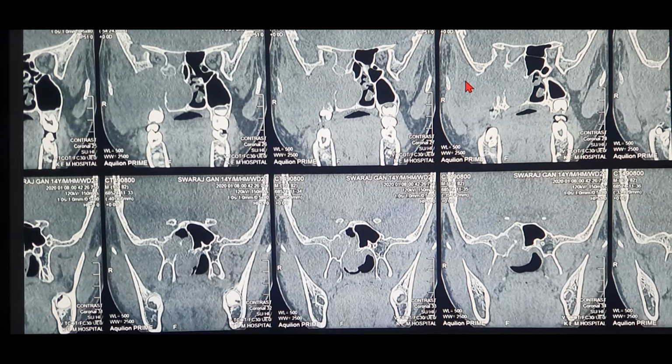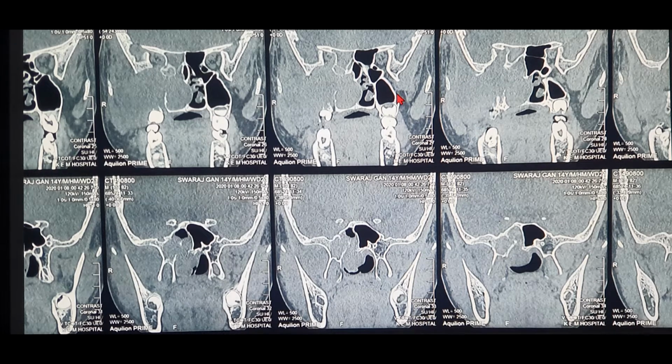Now, if it enters the sphenoid and it's a huge mass in the sphenoid, now from the sphenoid, the JNA will never enter the cavernous sinus. Okay, as I said, the JNA does not have any attachments in the sphenoid sinus. It is free lying there without any attachments. But how does the JNA then enter the cavernous sinus? It's very simple. It enters the cavernous sinus by destroying the pterygoid wedge, the pterygoid plates. And what we have just behind and above the pterygoid plates is the cavernous sinus.